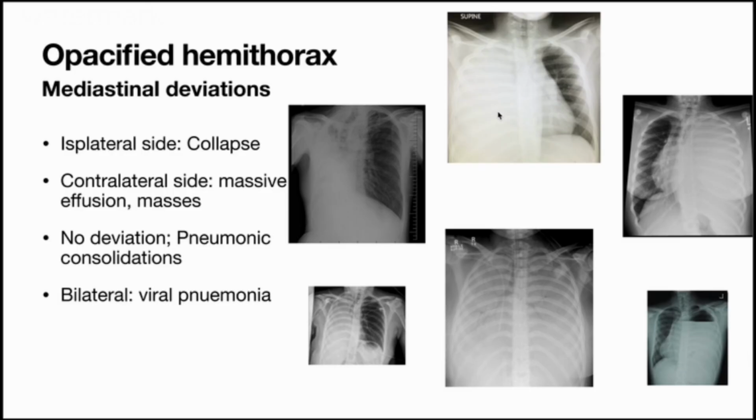These are the negatives. Then we conclude that the above features are most likely due to pleural effusion. On the other hand, if after you looked at the image and commented, you are sure this is most likely a collapse, then you want to state what you are finding, that is the homogeneous opacity and significant deviation of the trachea, and then you say these features are due to lung collapse, and of course you rule out the negatives as well, and so on and so forth.